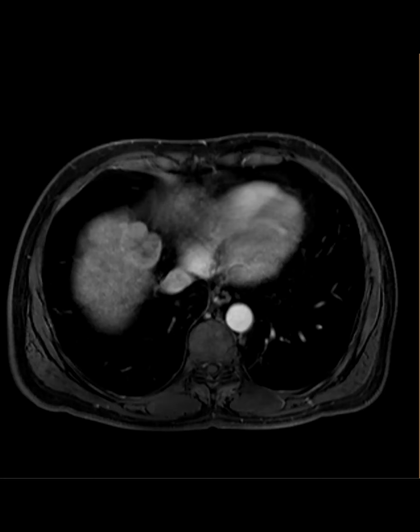This particular case, if you apply LI-RADS appropriately, should be categorized as M. I didn't know what it was going to be, but I told you I would have gone with an M. It makes sense, right? That's why it was washing out and had a capsule, because it did have the hepatocellular component.